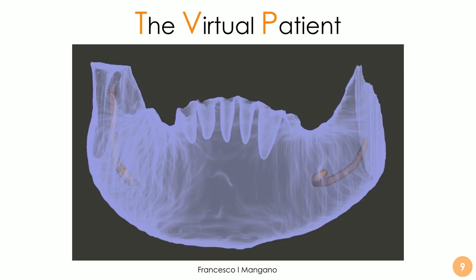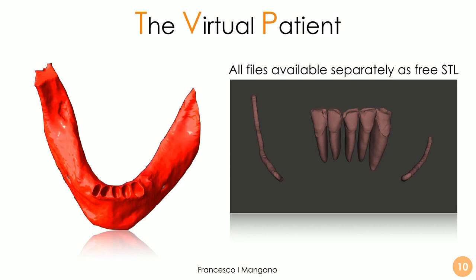Exactly like Diagno Cut, this application is incredible because it allows us to save a lot of time to obtain a predictable model to work with in a series of possible planning or applications. For example, we could plan eventually post-extraction implants in the case we want to extract this implant, but it's not the case. But look at how reliable the model is after the extraction. I mean, it's beautiful to see, and we can extract the tooth, we can isolate the mandibular nerve, we can play with the file totally free, and all files are available separately as free STL for download.